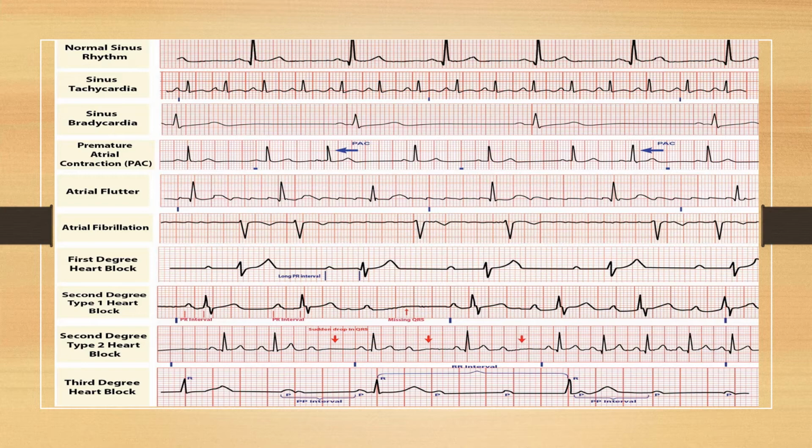Okay, so using the normal electrical pathway, it's just that it's fast. Why is it fast? Well, hypotension, fear, fever, pain. Okay, so those are things that can cause sinus tachycardia.